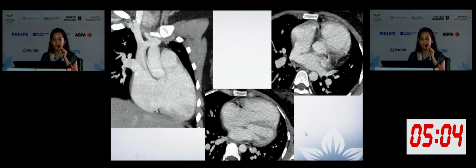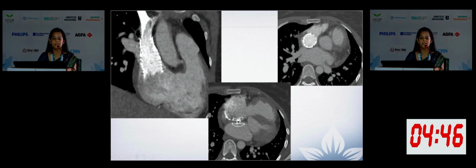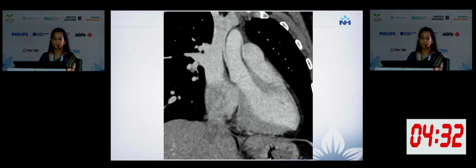This is another case, similar as you can see, a superior sinus venosus ASD with the PAPVC. How is this case different? There's an additional ASD. This is another thing you need to tell them. In this case, they have again done the stenting and completely closed the superior sinus venosus ASD, and they've also done a device closure of the additional secundum ASD. Again, complete percutaneous treatment.